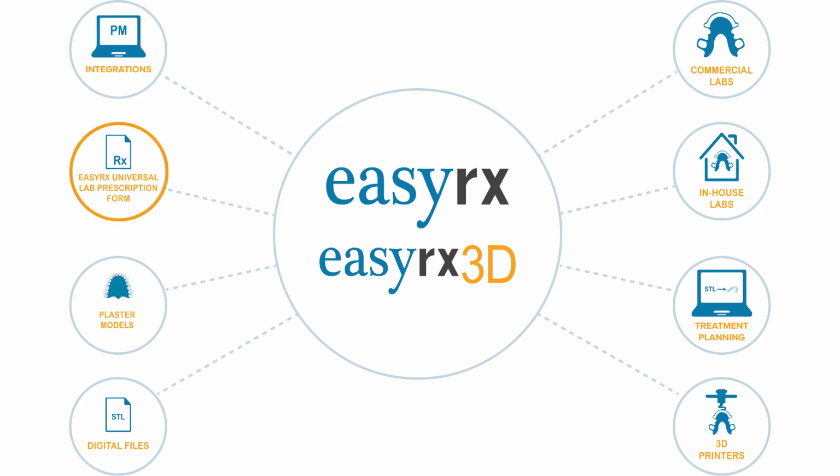Use the EasyRx Universal Lab Prescription Form to create all your lab, clear aligner, and digital prescriptions through one form. Submit cases to labs with traditional plaster models or impressions, or attach digital files directly to the prescription to send to your labs. With EasyRx, you can submit cases to your commercial labs or your in-house lab.